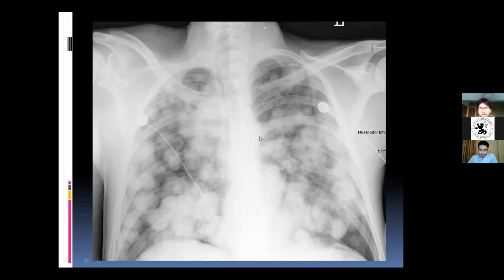All right, I think that's enough now. I hope you've written a good interpretation of what you see here. We'll see how that has changed after we go through the pathologies and how you would want to describe them afterwards. Also, to reiterate, this lecture is going to focus only on the abnormalities that you're going to see. You're not going to see normal things, which will make your life a bit easier because there'll be something abnormal in any of these x-rays.